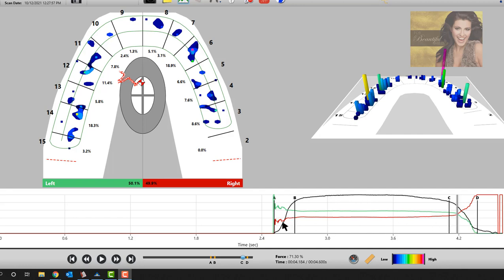guess is. So, for example, here we have these two lines. This is your occlusion time. First tooth contact is A. You're going into maximum clinch. At B, we pass through 80%, and we have a sustained clinch with the force line from B to C.